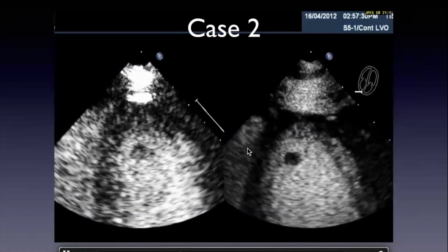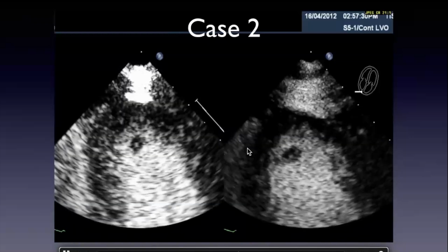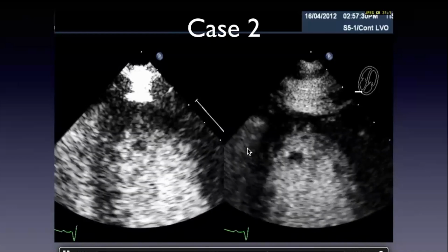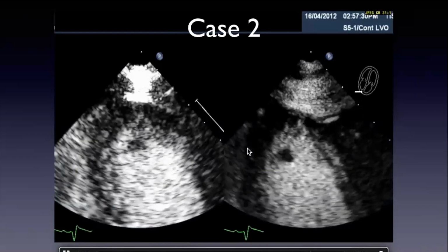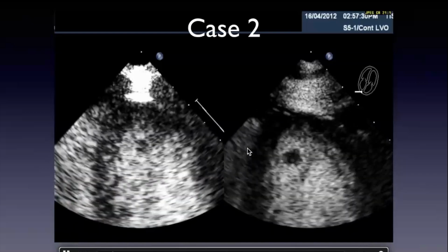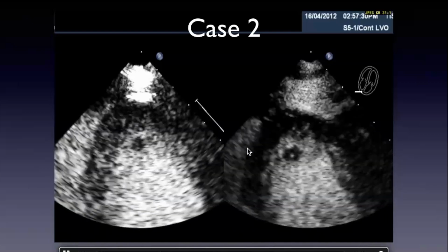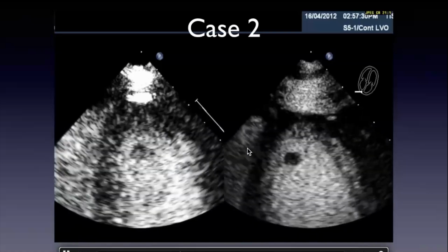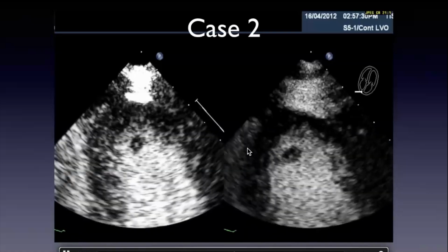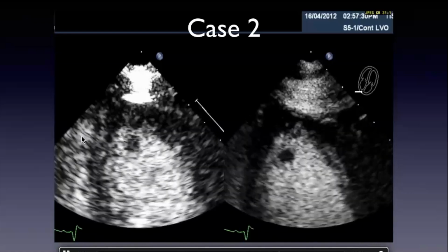Very unusual. It could also be, I'm not sure, to be honest with you, but that's another thought that I have, just a normal cardiac structure that we're seeing. So could this be something else? Could this be a muscle bundle? A papillary muscle would be a bit unusual in this location, but actually this turned out to be a muscle bundle.